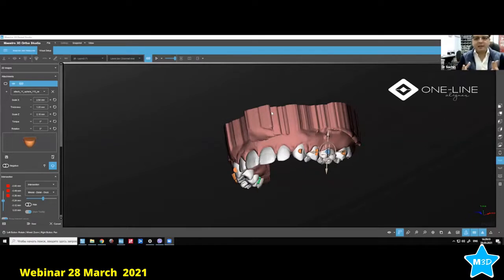We should understand that you have more surface area on the posterior and less surface area on the anterior. So we have more intrusion on the posterior. That is also one of the cases where we have open bites, so we have to compensate for that open bite by anterior movements. So the final touch will be the same. They will not change. Or you add attachments on the posterior teeth, which will keep the aligner in place with no intrusion effect.